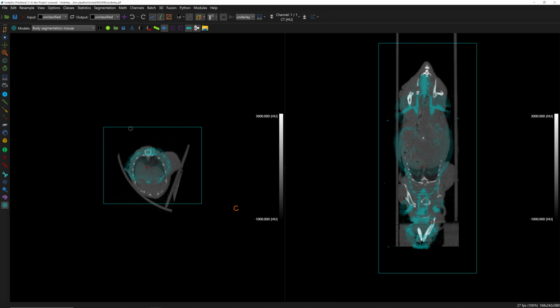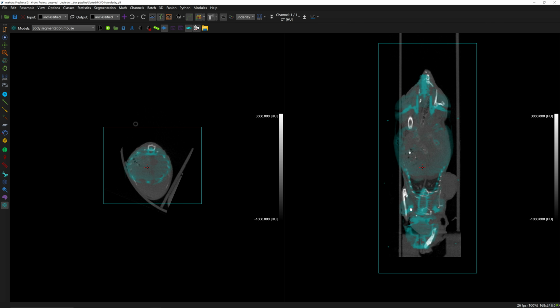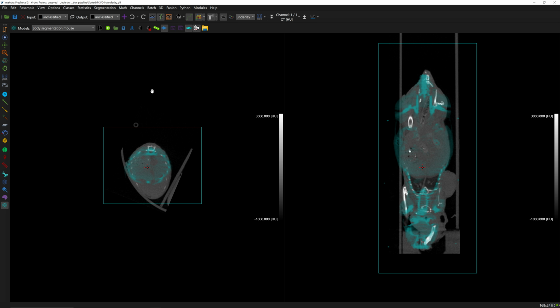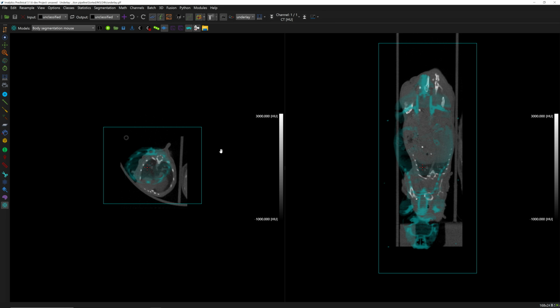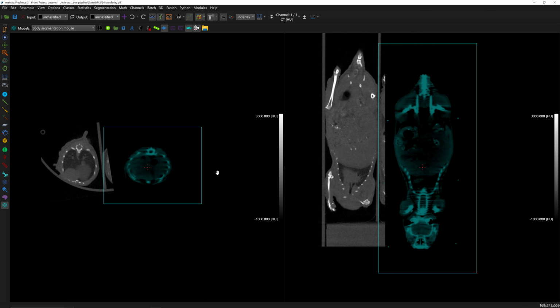Of course, the more mice you have, the more time it takes. Save. Next one.